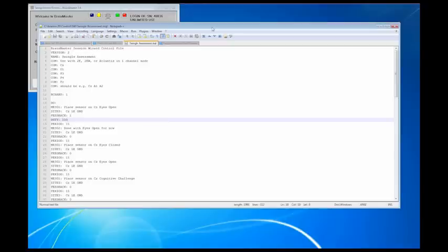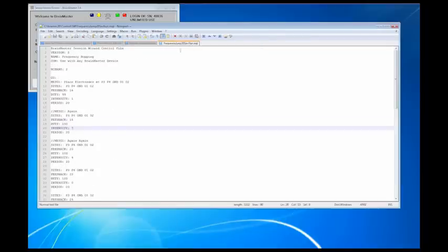And the reason I said it's very powerful is because for this last little bit of time, I want to cover some of the things you can do. Now, this right here is a kind of special protocol that we had written, and I'm going to show this to you and explain exactly what's going on with it. This file has a lot of things going on in it. I'm going to explain the basics so that you understand what this is designed for and what you guys can do with SessionWizard. This SessionWizard file we called the frequency jump.